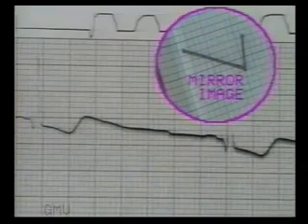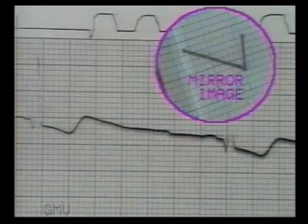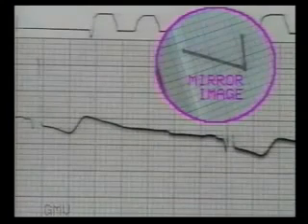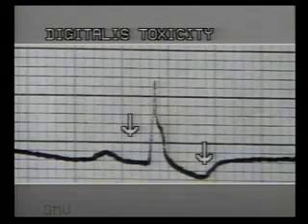The ST segment takes an angled downward slope and rises steeply upwards to join the T wave. The T wave is flat. It is best seen in leads with a prominent R wave. The inset shows the mirror image. In this ECG, note the characteristic ST depression with slow downward slope and steep upward rise.